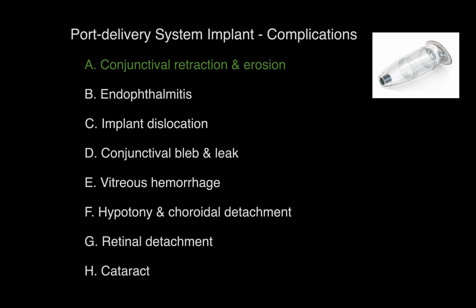Recommended management is conservative with eye drops and follow-up for small erosions. If they are large, conjunctival flap or reposition of the conjunctiva should be pursued.